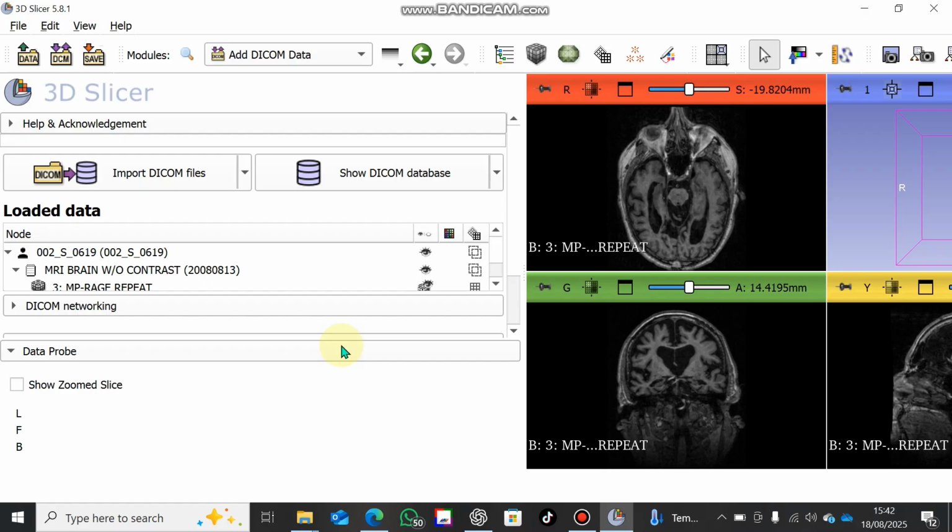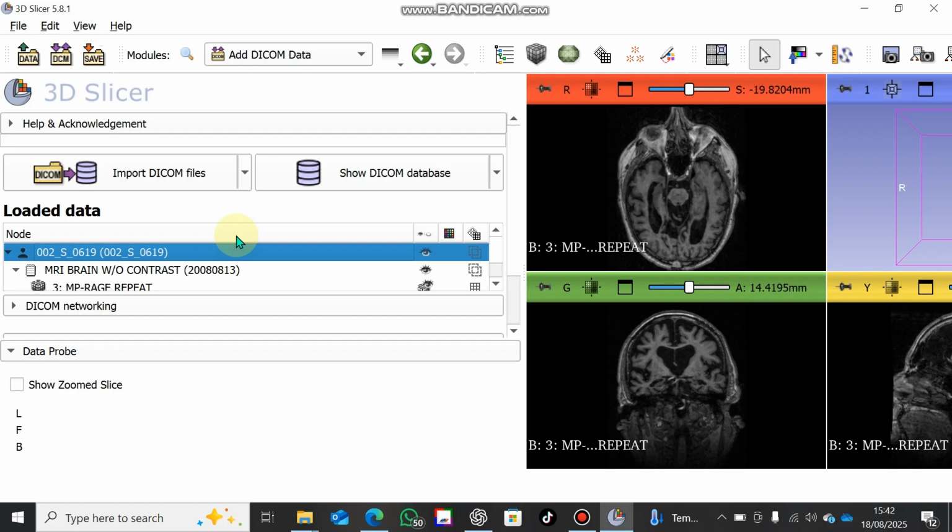But with all of this data, I have to extract the brain tissues one after the other. So I have to be patient with it, although it takes a bit of time. But since it's your work, you have to work very hard. What I did was save each of the images that I extract based on the patient ID.